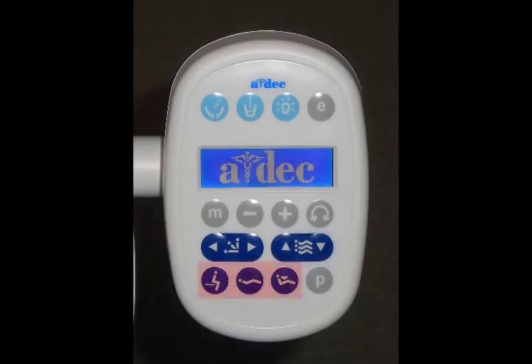The bottom 3 buttons are used for automatic programming. The lower left control will lower the chair and raise the back of the chair. This button is used when you want to allow the patient to exit or leave at the end of an appointment.